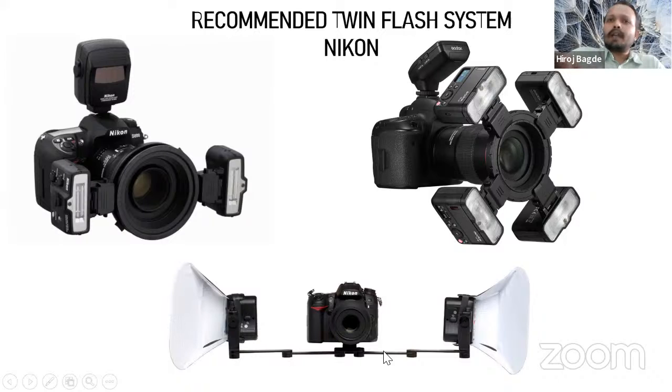They have attached an arm, called a scorpion arm, and along with this we have diffusers. A diffuser gives you a uniform and very subtle light spread, which means the light spreads evenly over the subject and is not harsh. If it is harsh, the details will be lost. So for us it should be very smooth light.